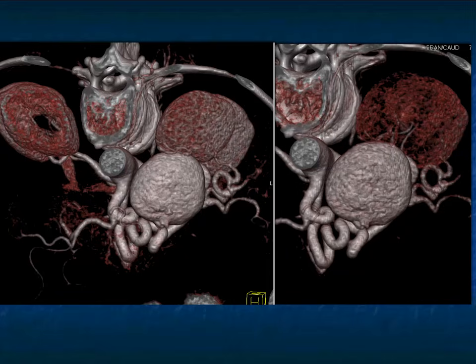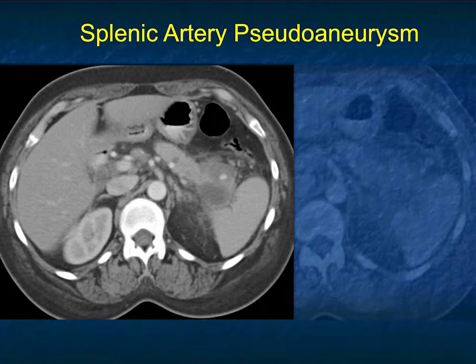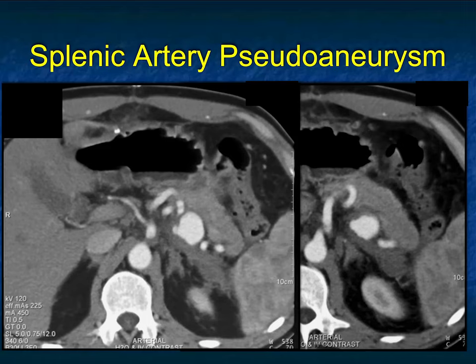These are the ones with a high propensity to rupture. These are the ones that will be treated aggressively, and typically surgery with resection will be done. I mentioned pseudoaneurysms, the inflammation around the aneurysm. Again, this can easily rupture, most commonly due to pancreatitis. Again, repeated episodes of pancreatitis can be due to trauma or other GI infections at times. Here it is very nicely shown with MIP imaging. I think using 3D, particularly MIP, and some volume rendering or cinematic rendering can be very helpful in these patients.